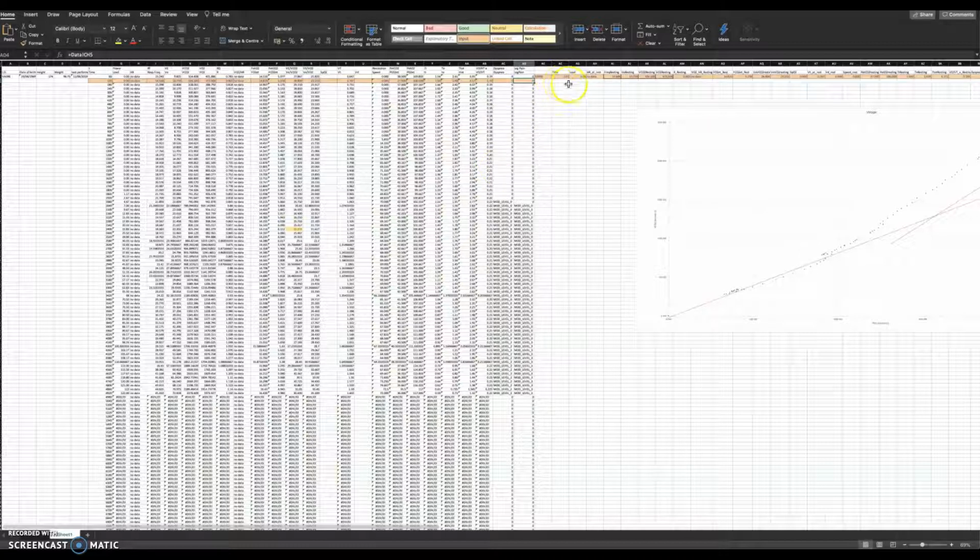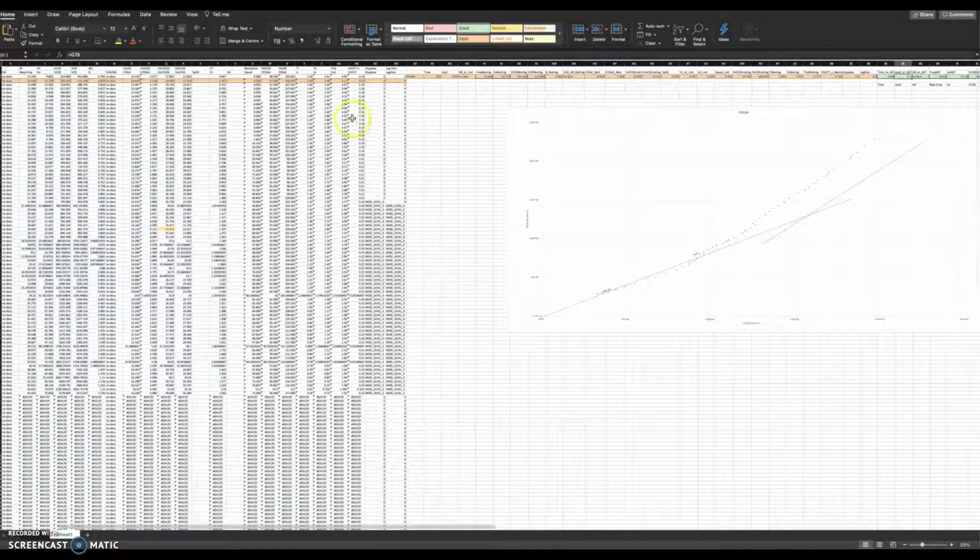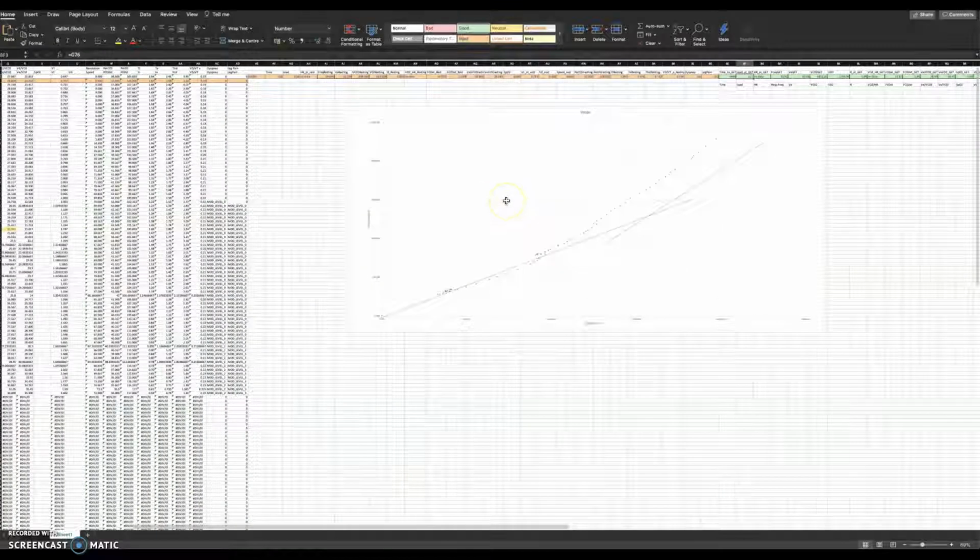And then this produces all this data here, okay? So it's the subject's ID, time, load, heart rate at rest, don't have it, frequency at rest, all these kinds of things. These are the things I'm interested in. The first one there, that peach color, is all resting data. So we have to do two other things.